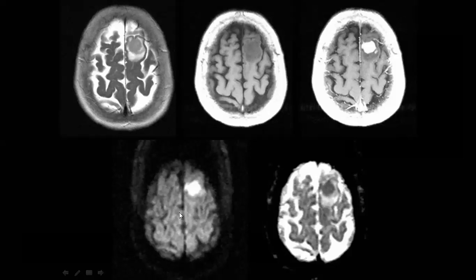So diffusion weighted images, when you see something high signal, bright signal in DWI, you cannot say that it is restricted. You just say that it is high in DWI. And the most important thing to look at is the ADC. In ADC, when you find something dark and it was high in the diffusion, then now you have the right to say that this patient has restricted diffusion.